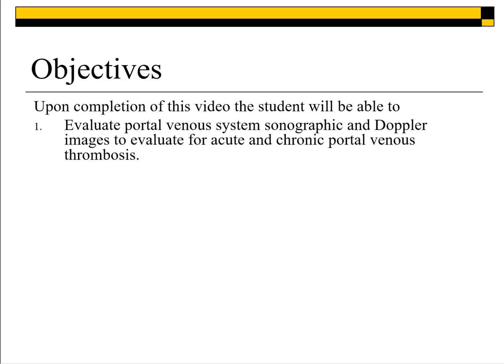Upon the completion of this video, you should be able to evaluate the portal venous system sonographically and with Doppler images to evaluate for acute versus chronic portal venous thrombosis and some of the pathophysiology behind that.